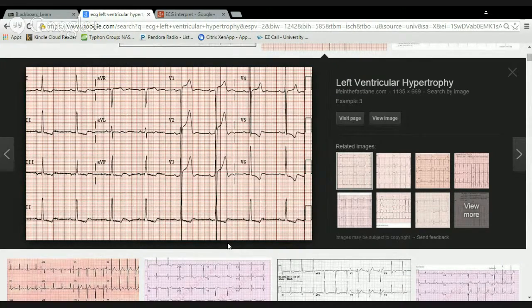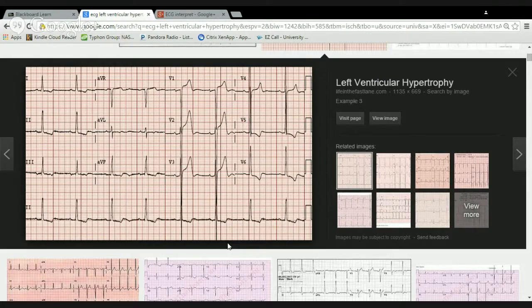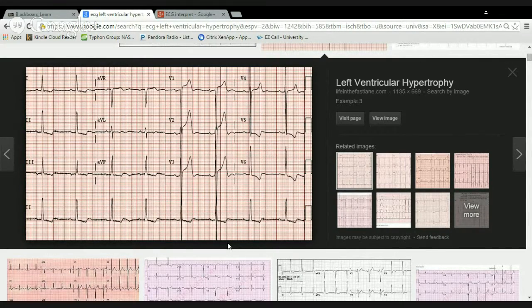This can also mean that there is ischemia to the circumflex. I do not see any pathological Q waves, meaning that there is not a wide Q wave being more than 0.04, or there's none at all. So there's no necrosis. So in summary, this patient is sinus Brady with injury and ischemia to the lateral and anterior leads, affecting the lateral, anterior, and inferior areas. So it could be affecting the RCA, the LAD, and the circumflex.